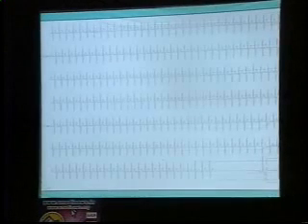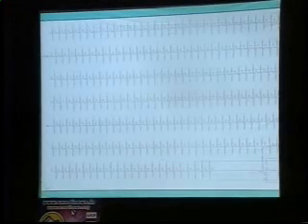This is a patient who came to me with the symptoms of recurrent syncopes, and his heart function was normal. He had a narrow QRS, normal sinus rhythm on the ECG. As soon as I took a detailed history, I just put him on a Holter. And luckily I got an answer on the Holter. What does this Holter show? This is a Holter tracing, please.